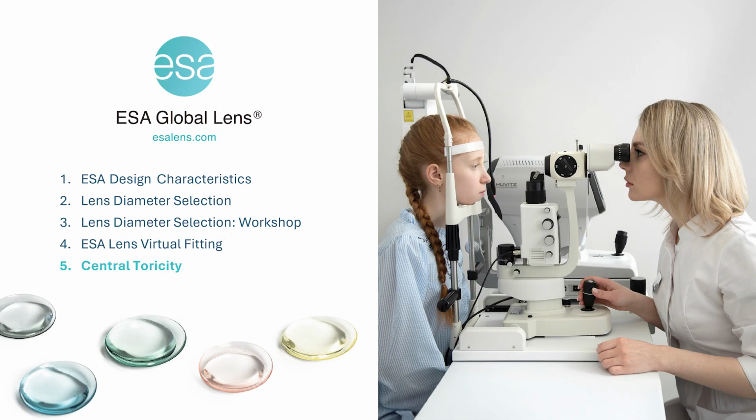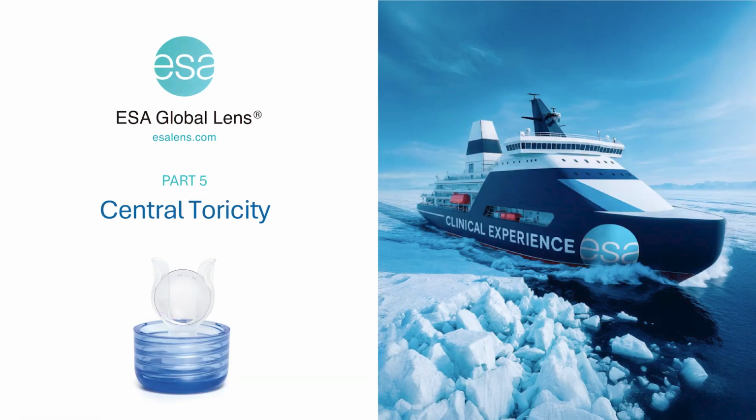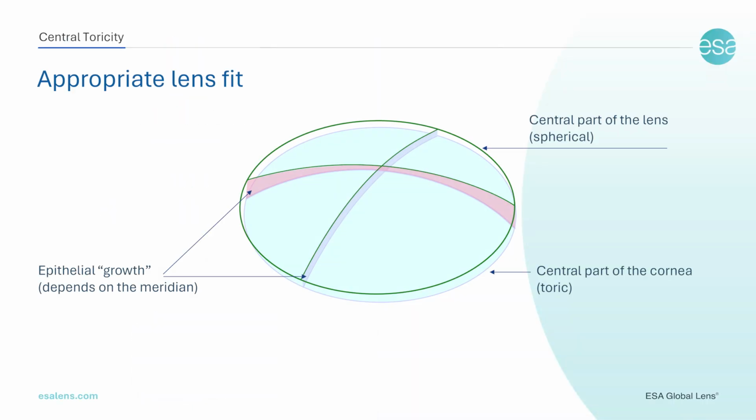The final part of this course is devoted to central toricity. The ESA design offers the advanced option to incorporate a toric optical zone. To correct astigmatism, a lens with peripheral toricity, a peritoric lens, is selected. Under normal circumstances, central corneal astigmatism is corrected automatically by the tear reservoir beneath the lens spherical center.